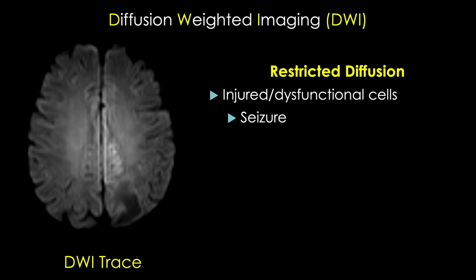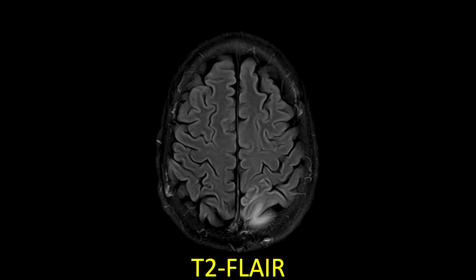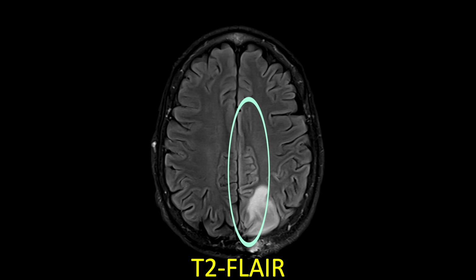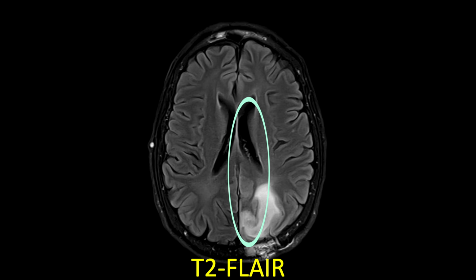Perhaps more importantly, we know this patient presented to the hospital for a seizure, which focused our search pattern on this case. You can see there's also gyral edema within this region on the T2 FLAIR images, another sign the cortex was damaged from a recent event.